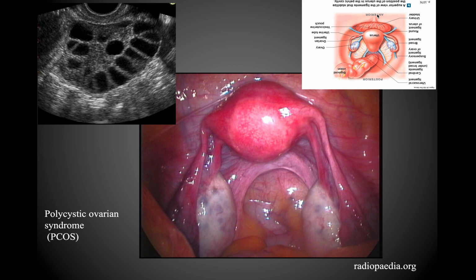So again, this would be anterior up here and posterior back here, just like on this image. And so you can see where the rectum is located. You can see the broad ligament. You can't see the suspensory ligaments like they're shown here in the image, but you can certainly see the ovarian ligament, the fallopian tube, the ovaries, and then the round ligament coming around to anchor the uterus to the labia majora.